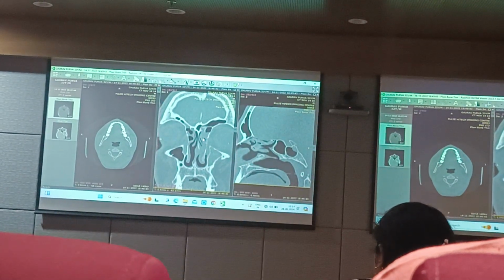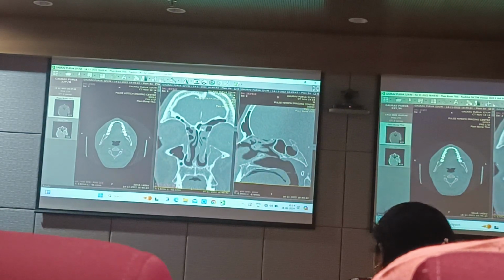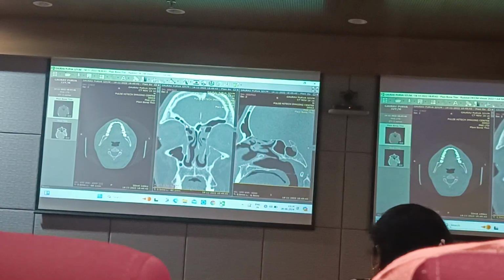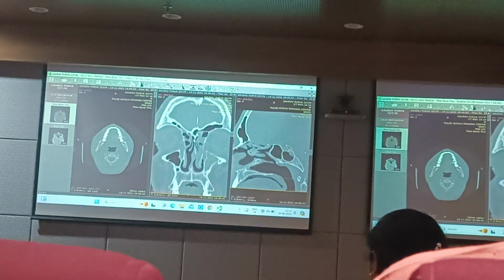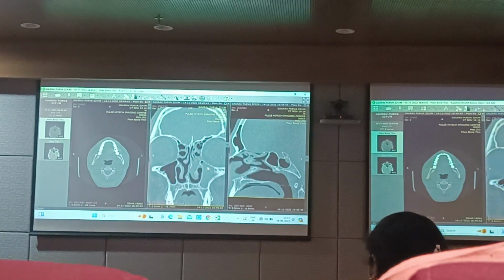Scan people report this as sinusitis. We ENT people say there is some greyish haziness. So this could be edema of the mucosa. Correct? What else can you see? Going back now, what else can you see here?